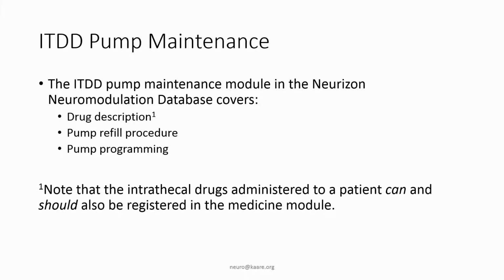This is because the ITDD pump module is only used for recording details on the configuration and refillings of the pump. It is not used to actually keep track of what medication the patient is getting.